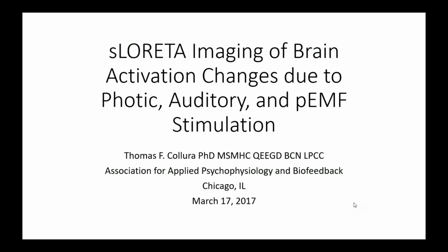Okay, I'd like to show some material that we presented a couple of years ago at the AAPB. Some of the work we're doing using ZBuilder and sLORETA to image the changes in brain activation that go with photic, auditory, and pEMF stimulation. Everyone has always been interested in what changes occur in the EEG when you stimulate, and this gives us a way to get a very good quantitative grasp of it.